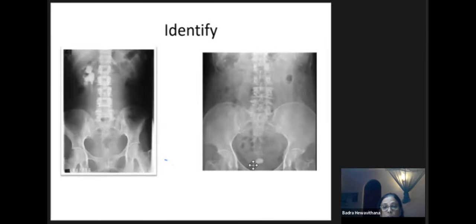And this is a vesical calculus. Sometimes people find it difficult, especially in females, like in this one, when there is a radiopaque area, whether it is a fibroid calcification or a bladder calculus. Bladder calculi are always in the middle because they tend to gravitate in the supine position, and usually they are oval shaped. So this is uniform or maybe a little lamellated, but usually they are uniform. So it is a vesical calculus. The main point is the central location of the calculus.